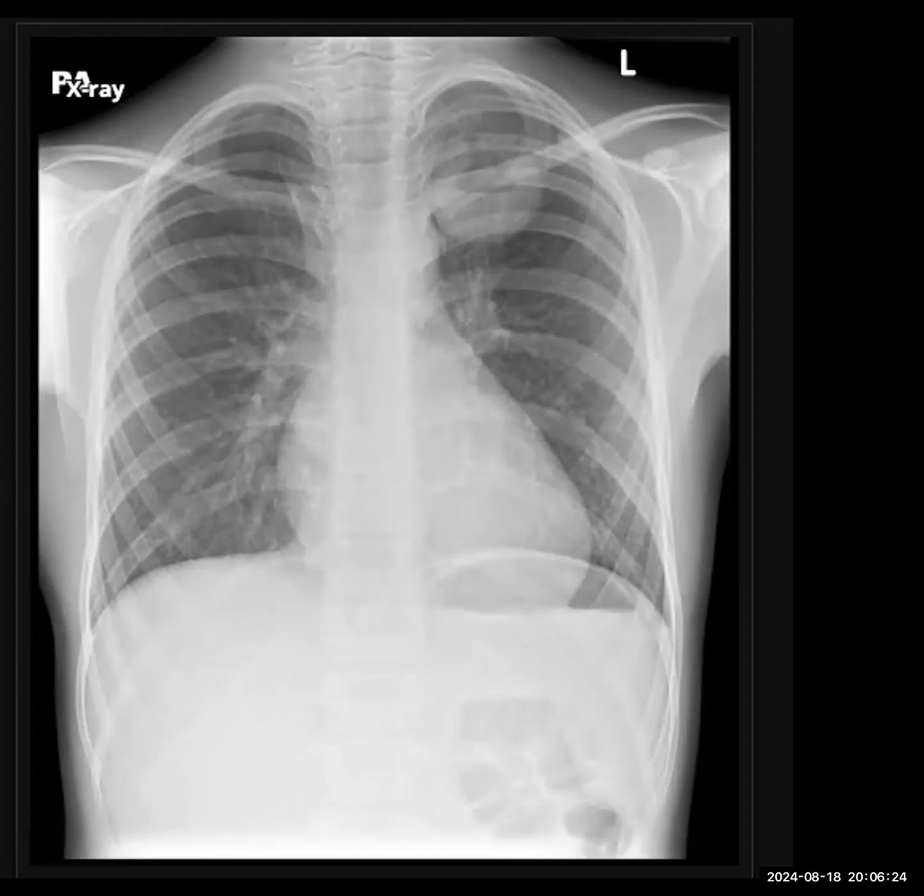Looking at the rest of the lung fields, they appear unremarkable. The bilateral costophrenic angles appear free. The cardia appears normal in size. So the only abnormality that I see is this well-defined opacity in the left apex.